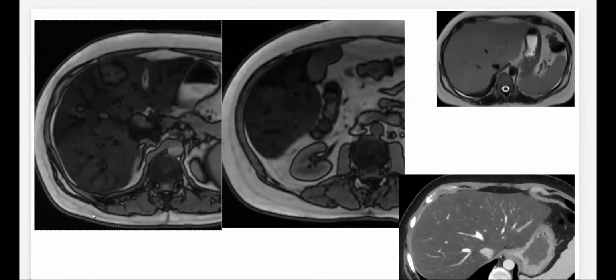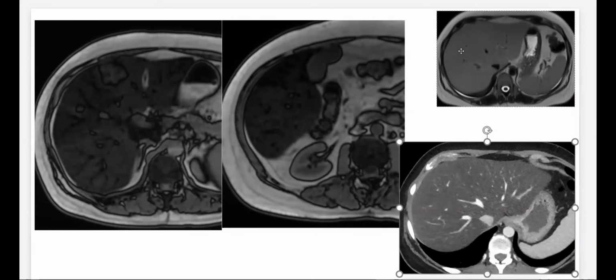Versus if the liver is supremely fatty, we see that the outline here is missing, and all the other structures like veins are outlined, and we do not see outline around the liver, which means the liver itself is acting like a glob of fat, similar to mesenteric fat. So the interface is just fat, and there is no India ink artifact. And I'm showing this T2 here because the liver is even more hyperintense than the spleen, and that's the CT, and the patient had hyperlipidemia induced pancreatitis.